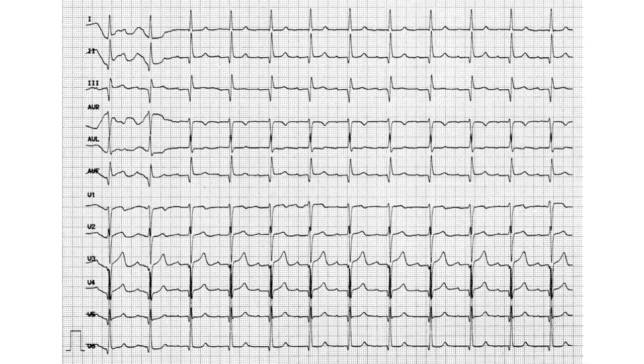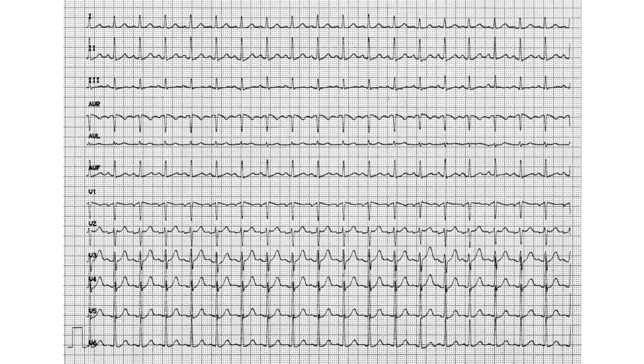Next question. That was question 34. This is question 40 of the script. So, question 40, and we check whether the rhythm is regular or not. And we start off. We do that scan. This is really not as easy as it looks to keep the hand stable. It's easier with a piece of paper. Using paper technique. Okay, so it is regular.